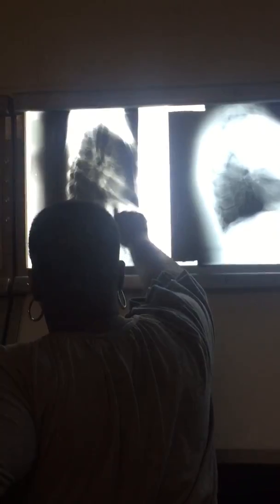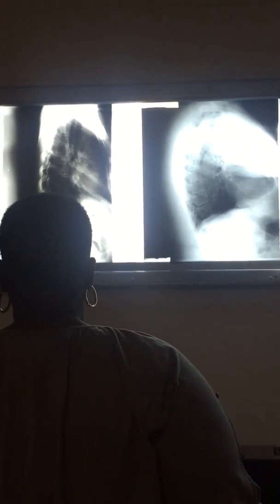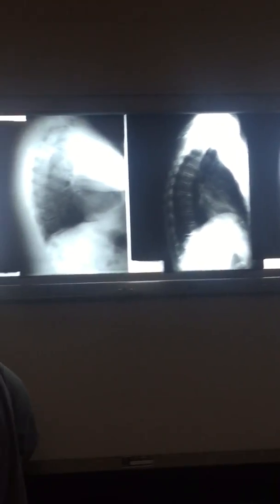Alright, so like I said, you need to know your intervertebral disc space, the bodies, and then in addition the heart, maybe even the diaphragm, the ribs, sternum, if it's there, scapula. Just identified. Of course, that little strip right there is part of the scapula too. Show diaphragm again. Pretty much covers the lateral projection. Like I said, you should be able to know the anatomy and know it's lateral projection. And that'd be pretty much the test.